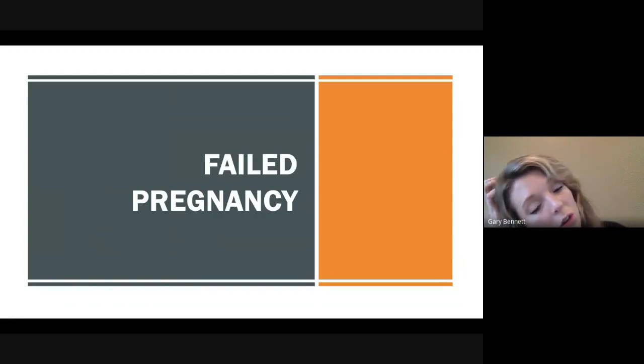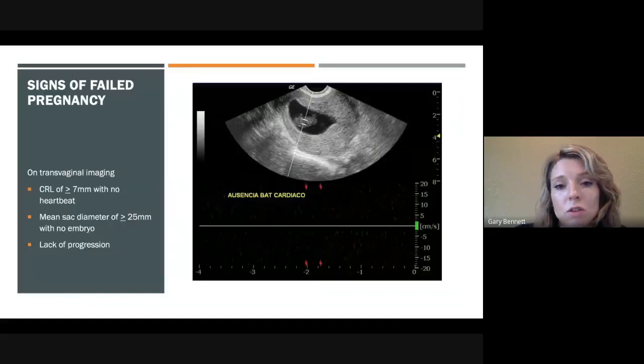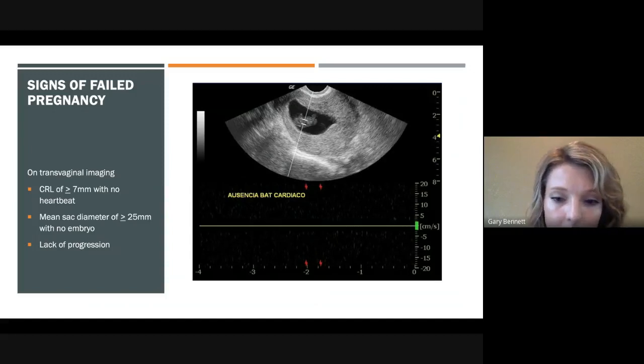Okay, so let's talk about failed pregnancy. In my opinion, quite likely the most important part of early OB ultrasound, because we want to make sure that the patient doesn't need intervention. So, some signs of failed pregnancy.